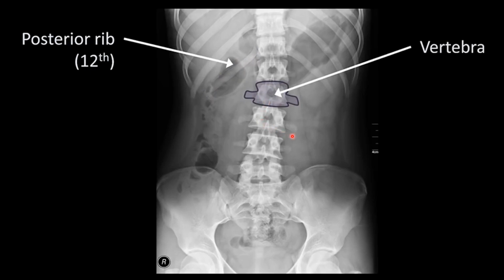If you look at the vertebrae carefully, you can identify the transverse process on either side of the vertebrae, and over this area you can see the spinous process of the vertebrae. And what you are seeing here is this roughly quadrangular structure will be the body of the corresponding lumbar vertebrae. In between the vertebrae you have this space. This is a radiological space, and this space is actually occupied by the intervertebral disc, and the outer part of this intervertebral disc is made up of fibrocartilage. That is why it is appearing as dark shadow.